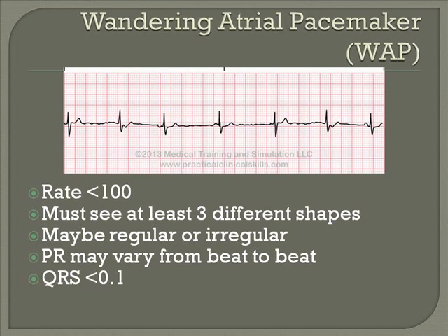The fact that it's coming from another pacemaker is determined by the differing shapes. If it's coming from the same pacemaker, the P waves beforehand will all be the same shape. If it's coming from a different one, it will have a different shape.